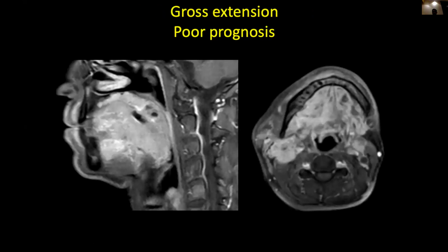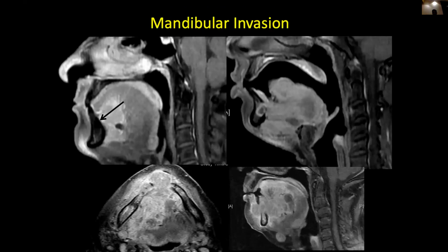Then you have a very extensive involvement of all the spaces. You may have masticator space involvement and other spaces involvement. This is very poor prognosis and gross extension of the disease seen in this particular example.